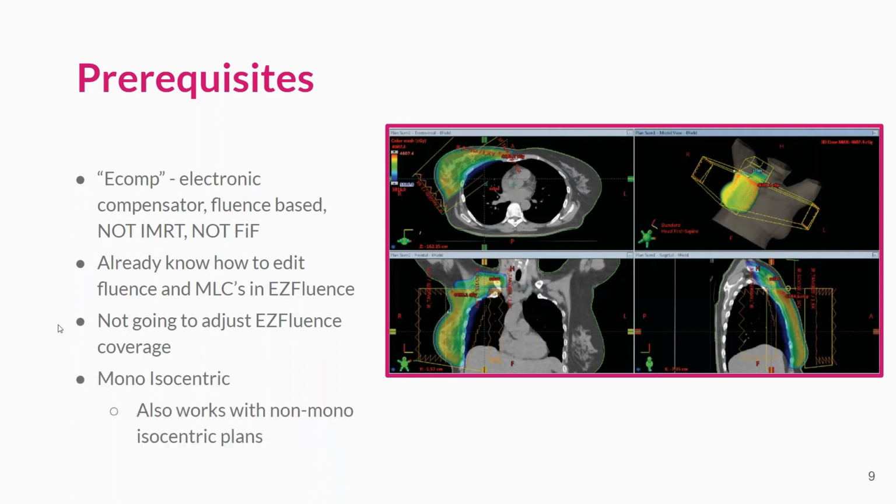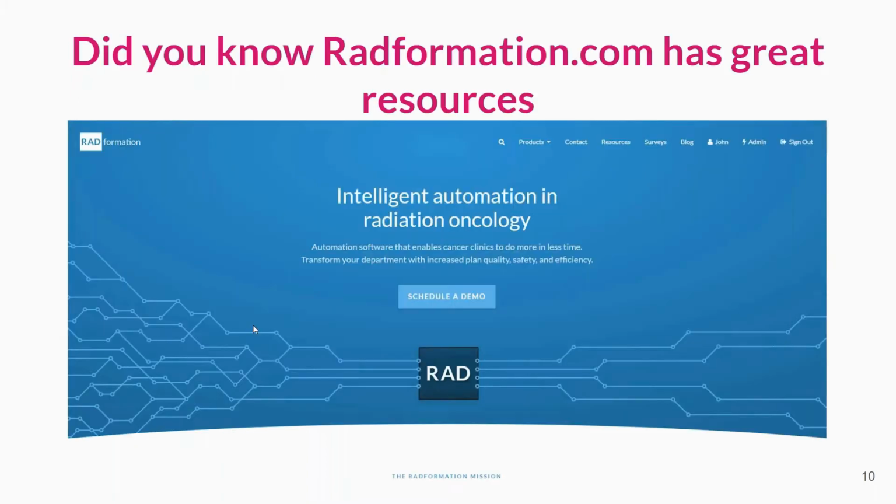And then lastly, I'm going to be showing everything in a mono isocentric plan. The same thing can be achieved using non-mono isocentric plans, just with a few more couch kicks.